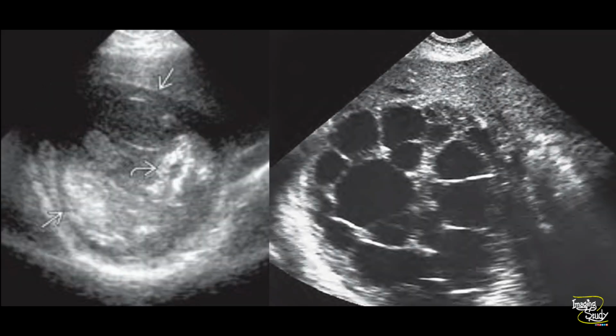Here you can see a complex echogenic mass with enhanced transmission evidenced by the well visualization of the posterior part. There is a curvilinear echogenic scolex and highly echogenic debris forming the complex nature of the cystic lesion. On the right image, you can see the classic appearance of the honeycomb appearance of the hydatid cyst.